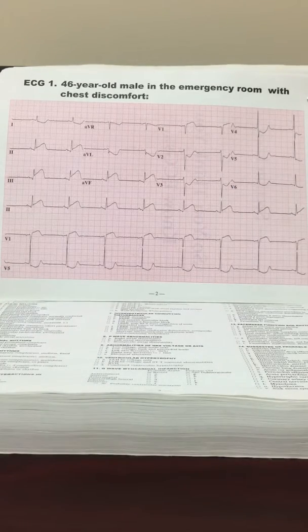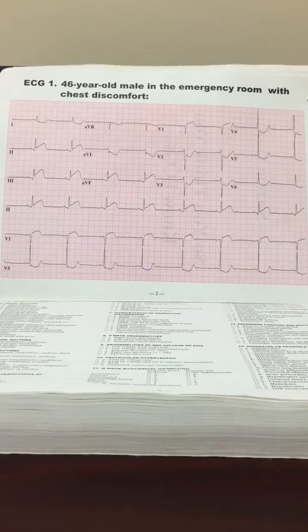So this is once again an EKG which is probably very common in our medical careers, MI and bradycardia, and this is just a systematic approach to interpreting this EKG. So I hope it helped, and good luck.